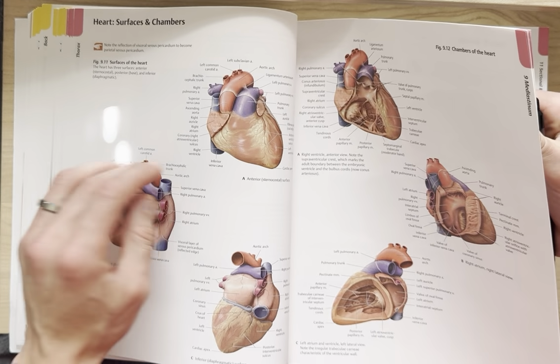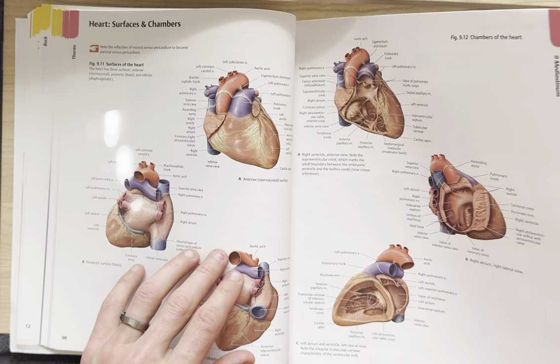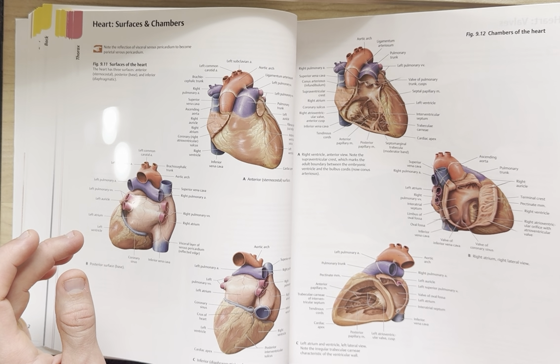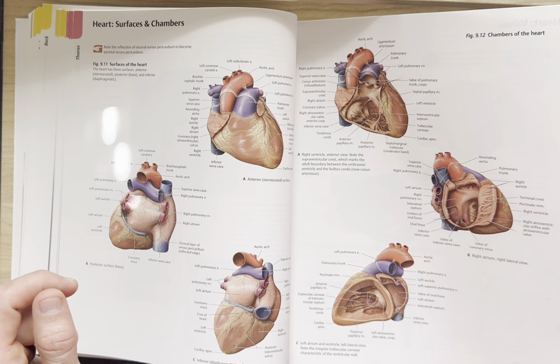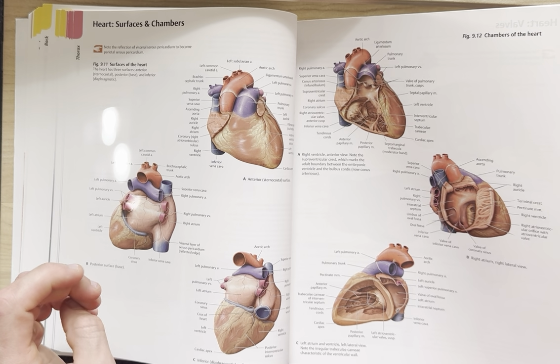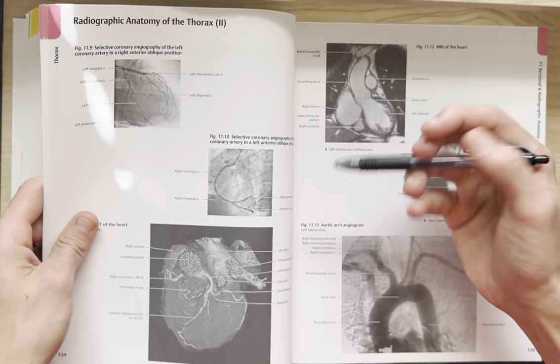Let's see if I can find the right coronary. I'm bummed that I can't find a better picture that immediately applies. I had tried looking beforehand, but sometimes things don't just work out the way you want right away, and that's just life. But that's okay. We'll continue on.